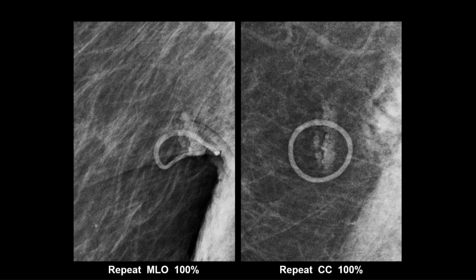So I'm curious, because this is one of the cases where I thought, well, I guess I went down the tubes on it because I don't see anything. But I would not recall it because of the air. Okay. If you're confident that it's air, you could do it, but it looks so irregular that, why couldn't it have been a cancer that was fairly close to the skin that actually grew out to the skin and caused a finding?